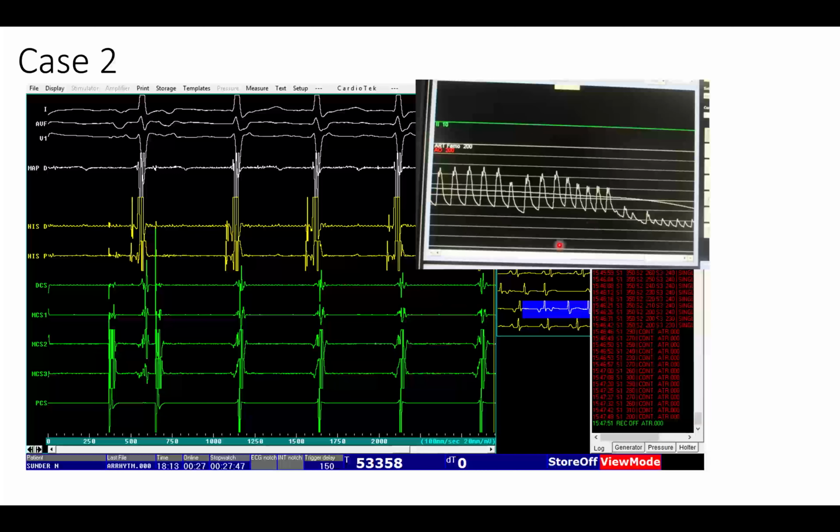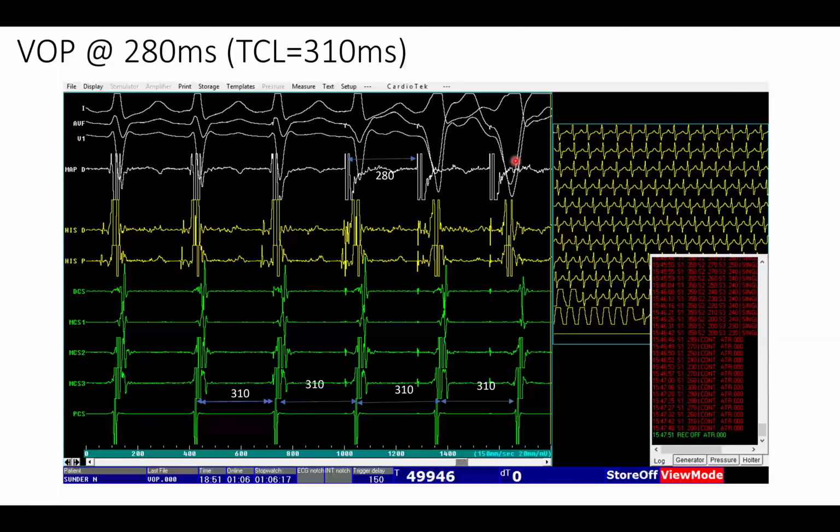I wanted to show this example because a few supraventricular tachycardias may be really troublesome for the patient because they are hemodynamically unstable. So some supraventricular tachycardias are really hemodynamically unstable and trouble the patient. So you should not treat all AVNRTs as benign tachycardias. Anyways, this patient is running tachycardia.